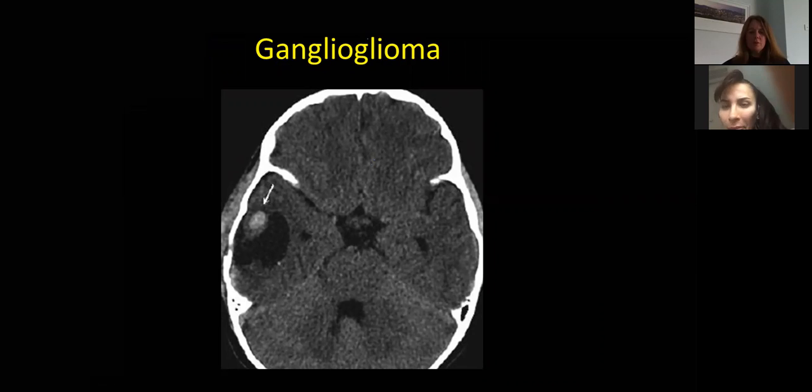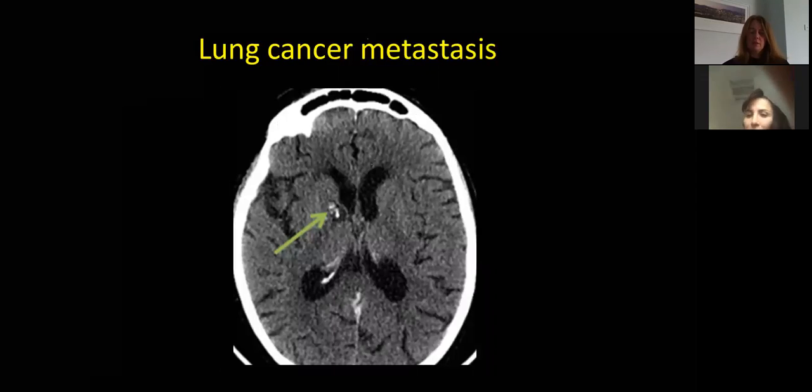Other intraaxial tumours, this looks less like an oligo. It looks almost more like a pilocytic, to be honest. Slightly more dense, well-defined calcification, a little bit of isodensity around about it, and then this sort of cyst with, you do wonder if there's a bit of solid component here as well. But something to think about when you've got a calcified intraaxial neoplasm.